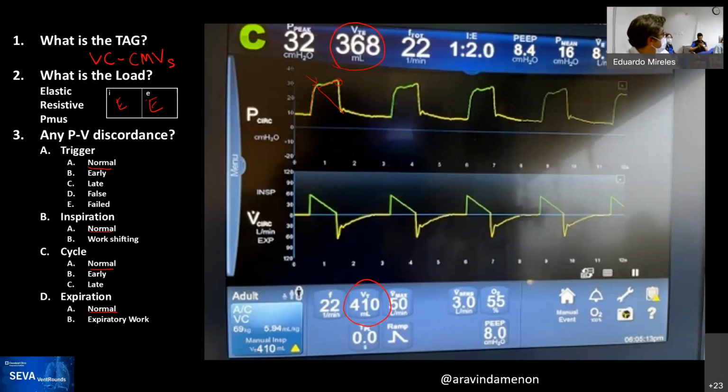How about if there's something with the flow sensor? Okay. The difficulties with the flow sensor, issues with the flow sensor, Rob. What do you think about that? Not on this ventilator, probably. I believe this is a Puritan Bennett 980, and they don't use a proximal flow sensor. It's an internal flow sensor, and if that's shot, then it needs to be recalibrated. Very good. Any other comments on the chat before we move on?